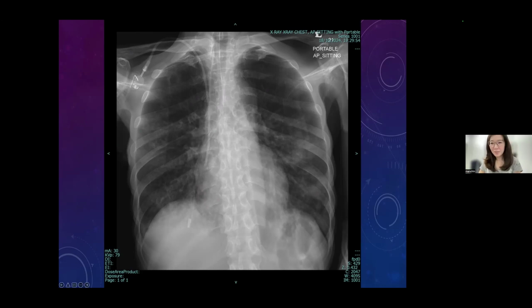Yes, so okay, everyone. Doesn't the patient gag? Won't the patient gag? I'm not sure, but this is the X-ray. It's very uncomfortable to have a tube in your trachea. Definitely. Someone is not intubated though, just an NG tube. Of course. Yeah.